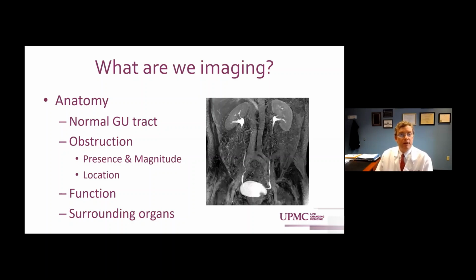Other things that you, of course, want to know with respect to obstruction: is that obstruction being caused by the stone? A lot of times we'll see a system that's obstructed, maybe there's a ureteral stricture, and the stone just happens to have settled there. So put that in the back of your mind: is that obstruction really due to the stone?